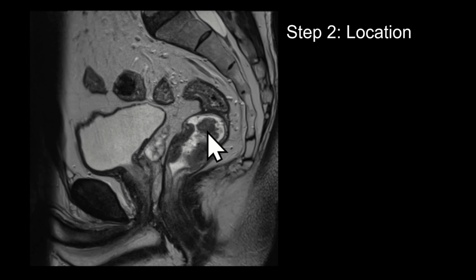Okay, so once you've found the tumor, the next step is to define the location. So first, we want to define the distance from the anal verge.